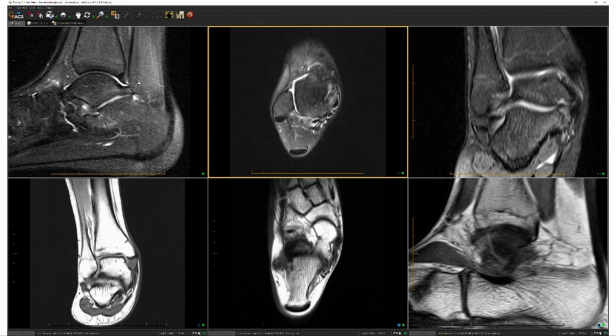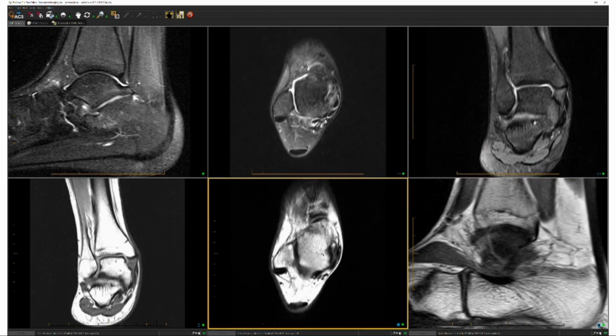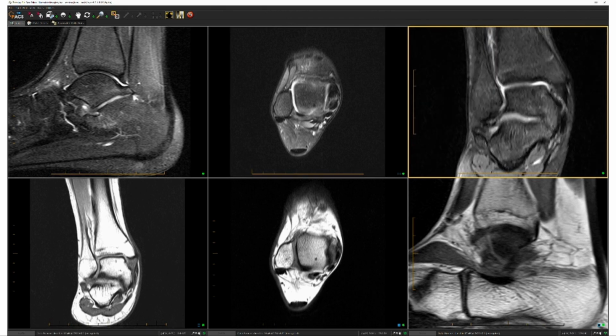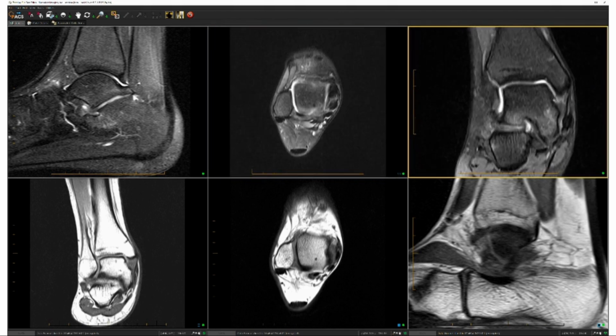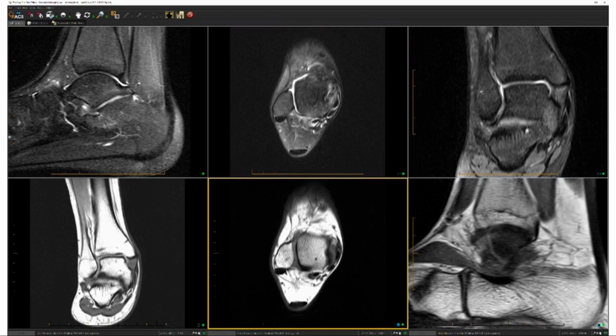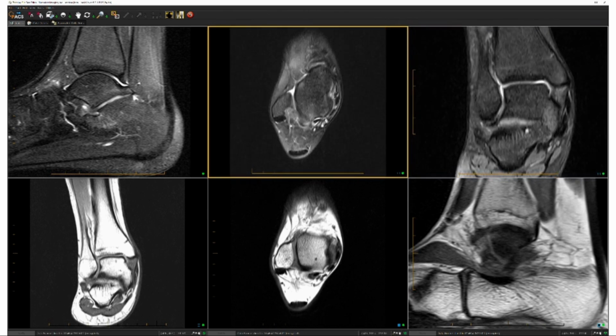Then we can move over to the medial ligaments. Let's get a sense of the deltoid. And when I'm looking at the deep deltoid on T1 weighted images, I'm noticing that I cannot find the bands as discretely as I like to. This is a little bit better, but this is kind of inhomogeneous and poorly defined. And that is a location where we're having some mild sprain of the deep band of the deltoid. So that's the deep deltoid, and it's mildly sprained and thickened. And I would give that subacute to chronic. I don't see much synovitis. So just the trace edema or trace signal makes me think subacute to chronic or subacute on chronic.